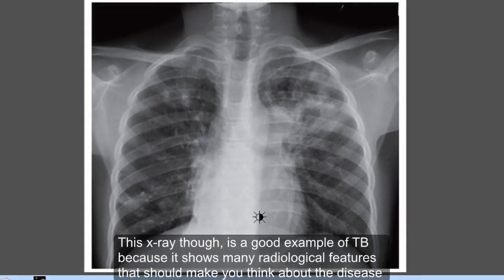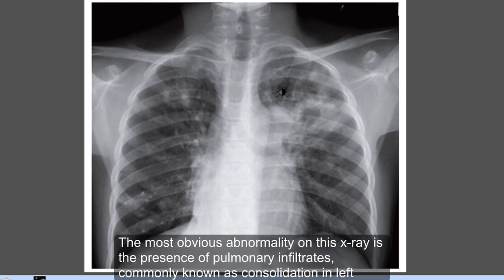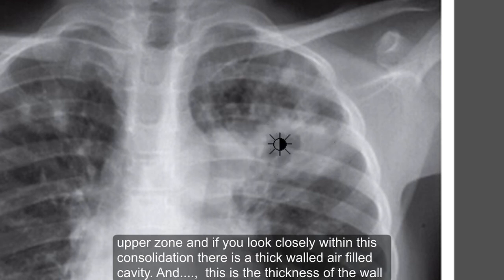This X-ray though is a good example of TB because it shows many radiological features that should make you think about the disease on the X-ray alone, especially if the patient is HIV positive. The most obvious abnormality on this X-ray is the presence of pulmonary infiltrates, commonly known as consolidations, in left upper zone. And if you look closely, within this consolidation there is a thick walled air filled cavity, and this is the thickness of the wall of the cavity.